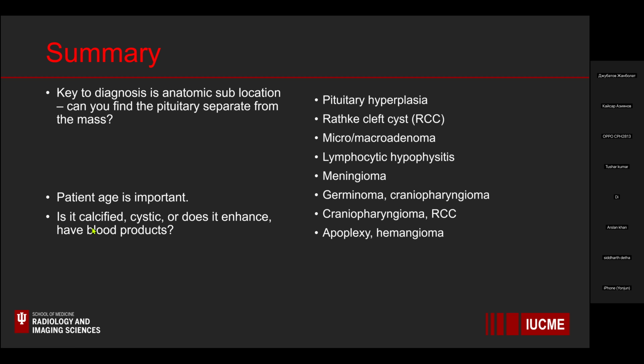The third clue is the lesion calcified? Does it have cysts? Does it enhance or not? Does it have blood products? And we saw with craniopharyngiomas, they can be very solid.